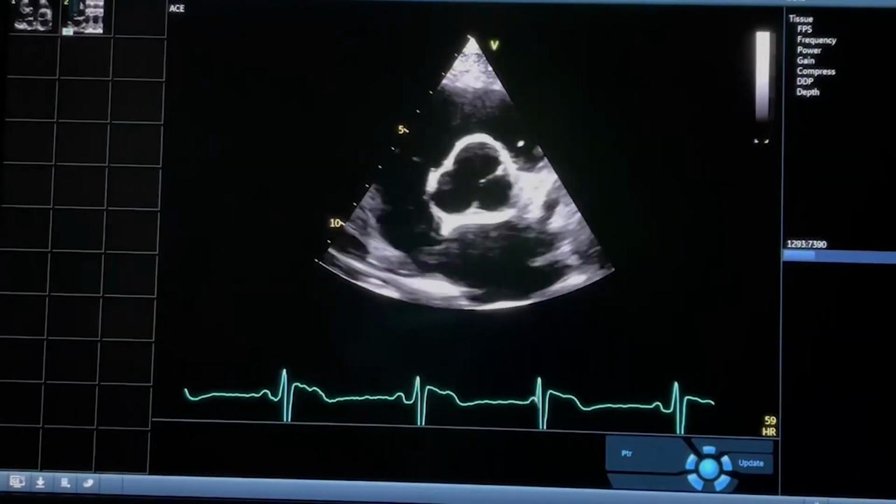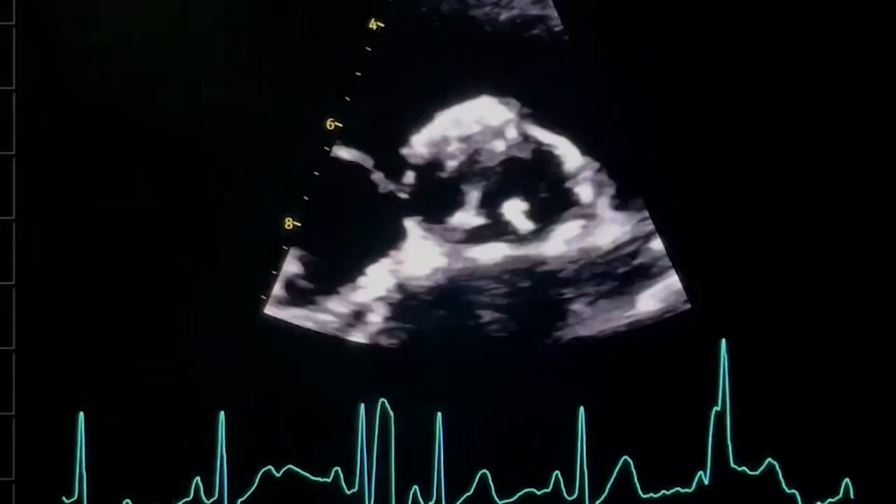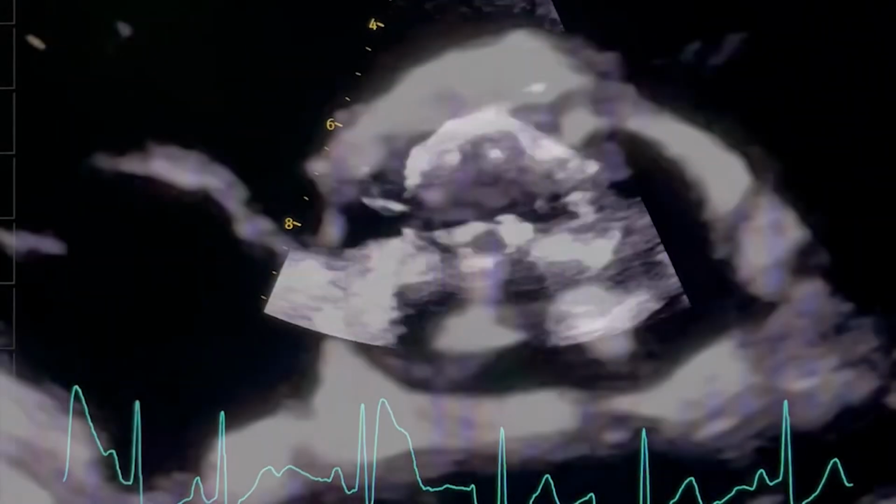Next, we zoom in on the aortic valve to look at the morphology. This is a bicuspid valve with a raphe posteriorly. The fused cusps are of the left coronary and the non-coronary cusps, and there is an elliptical orifice, which is the hallmark of a bicuspid valve. You can observe the calcification on the raphe and modest calcification of the cusp margins.